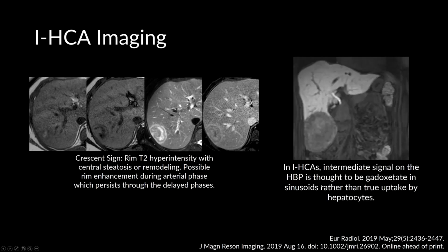And then here on the hepatobiliary phase, you can see that there is some increased signal within the lesion. This is thought to be the gadoxetate collecting or staying in the sinusoids rather than true uptake within the hepatocytes when it comes to inflammatory hepatic adenomas.